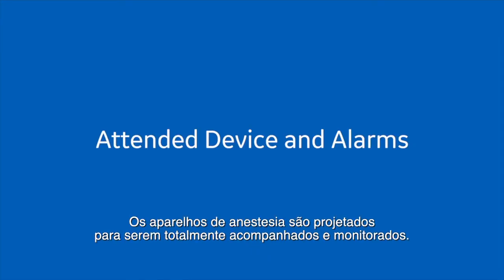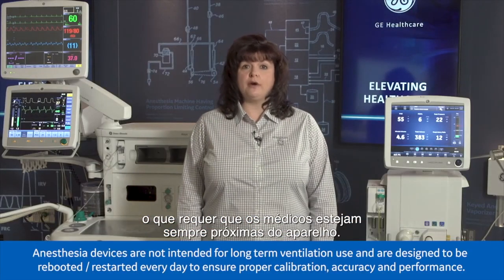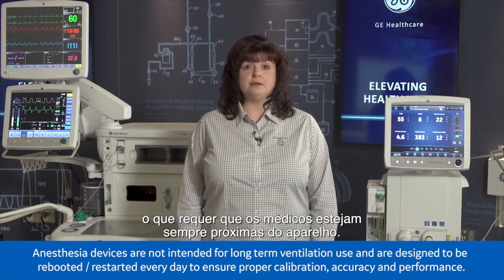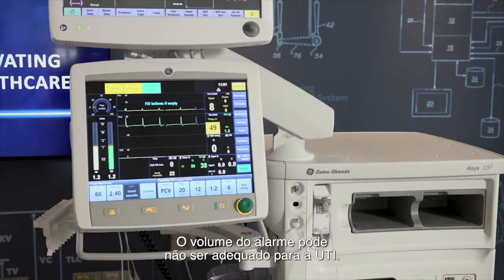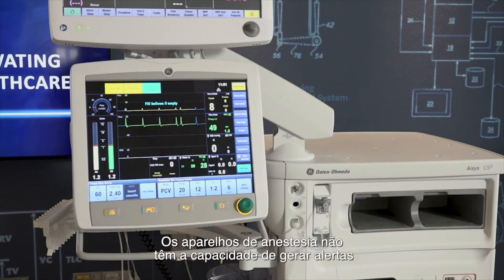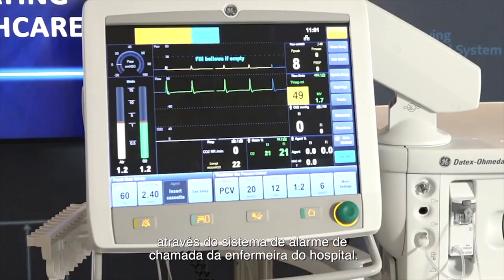Anesthesia devices are designed to be fully attended and monitored devices, which requires clinicians to be in proximity of the device at all times. Alarm volume may not be adequate for the ICU. The anesthesia machines do not have the ability to generate alerts via the hospital nurse call alarm system.